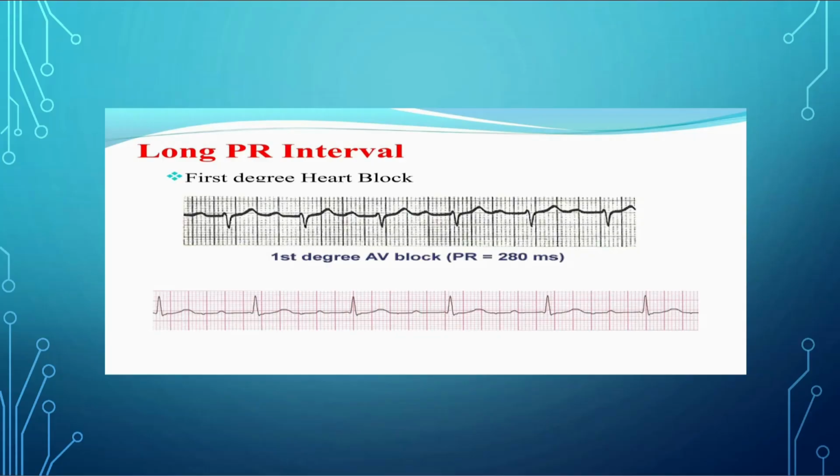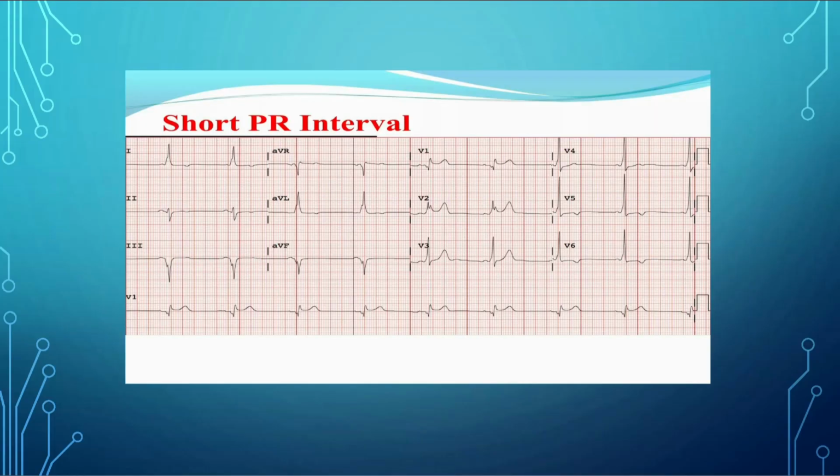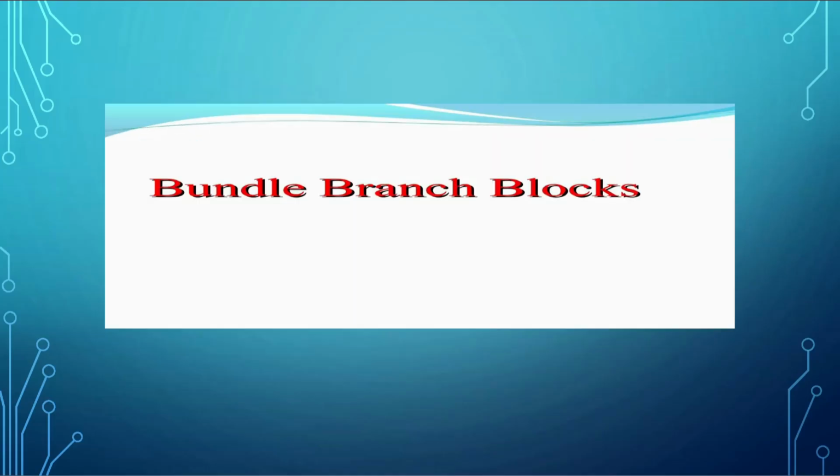So this is the long PR interval, first degree AV block. So this is PR. So PR interval, long PR interval. You can see the short PR interval, very short PR interval here. It is present in WPW syndrome.